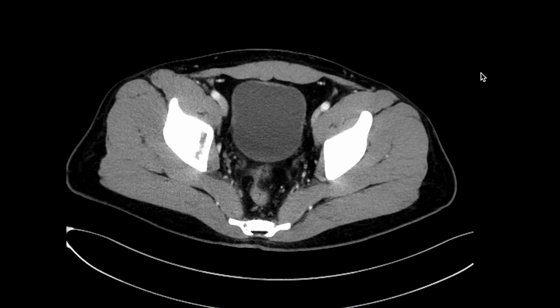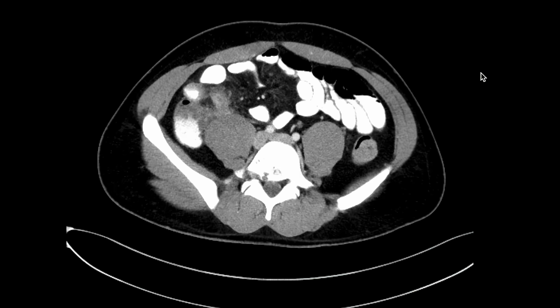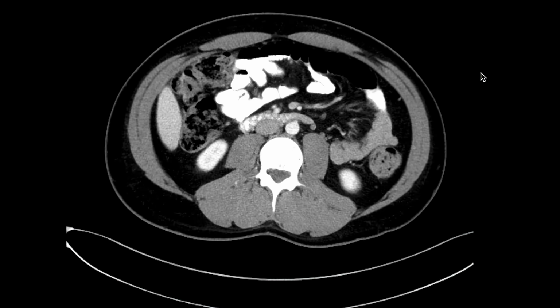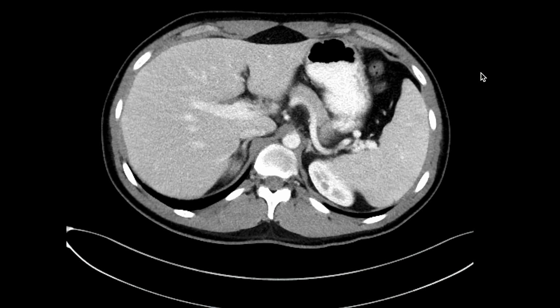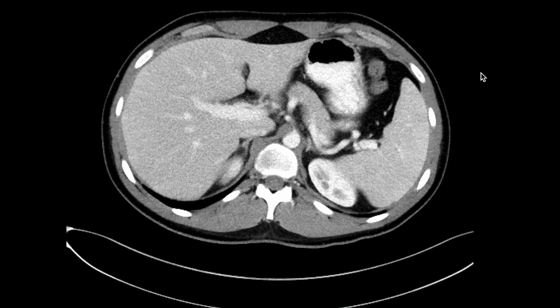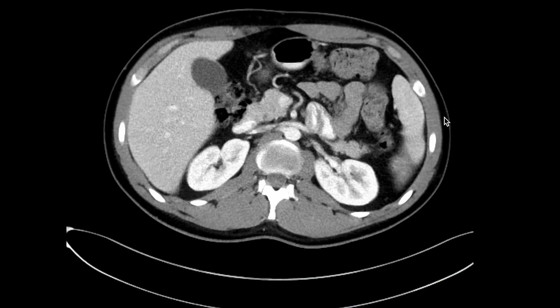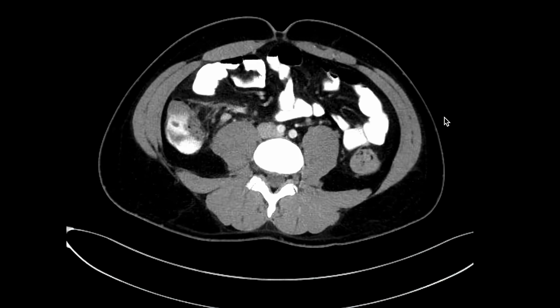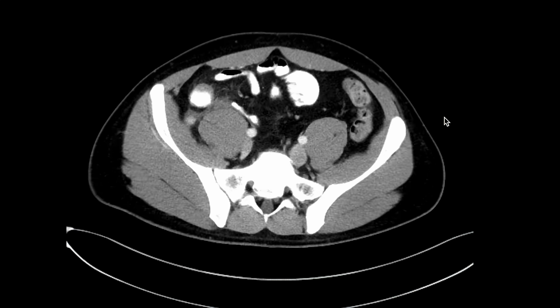And it's important to do this because not only do you want to know what you're getting yourself into, but you also want to have a general overview of what's going on with this patient. And second of all, if you see something that's absolutely emergent, you want to look at it more closely and call the referring clinician. The other thing is that when you're so focused on looking at very small areas of the scan, and you look at the liver and the spleen and the kidneys, etc., you really get tunnel vision looking at those specific organs, and you miss the big picture and often can miss findings even when you're so zoned in. So I always start with a scroll down and a scroll up looking for obvious abnormalities.